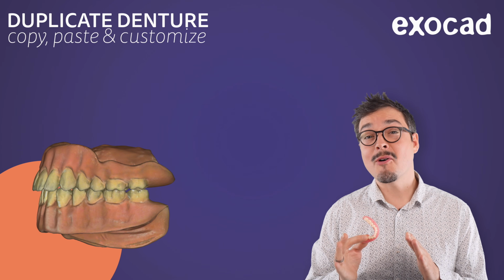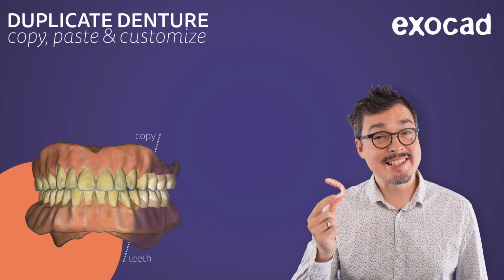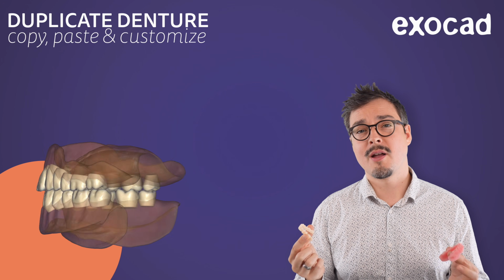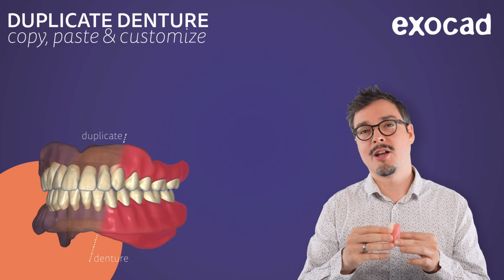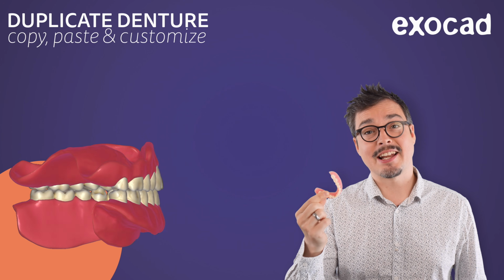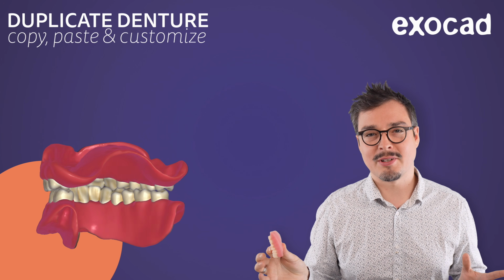Now we have seen how easy reproducing a patient's existing denture is using exocad's highly automated workflow. Whether you're creating an identical copy or enhancing the design with exocad's powerful tools, this exciting feature offers remarkable possibilities.